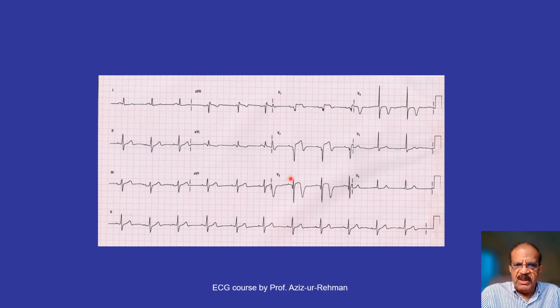This is another patient who has again presented with chest pain, but the duration was a little more. Okay, now let's examine this ECG in the same fashion. First, see the rhythm lead. This is the continuous recording of limb lead 2.